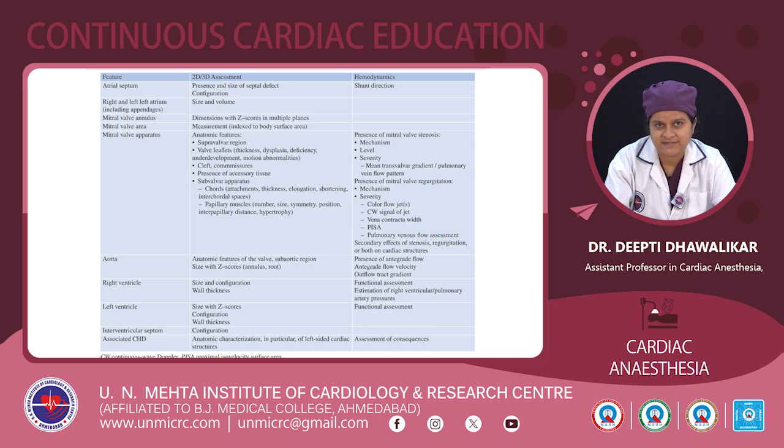So these are some of the features which we use while assessing the mitral valve. Basically we see the supravalvular region first, then the valve morphology of the leaflets, including thickness, presence of any form of deficiency or dysplasia or underdevelopment, or any motion abnormalities. We look for any clefts, and we see the commissural areas. We also assess for the presence of any accessory tissues, and then the subvalvular apparatus including the cords and papillary muscles.